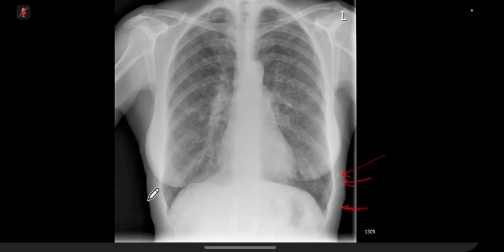So the smoking has resulted in emphysema, but the patient has also got cystic lung disease by virtue of the fact that there is cystic lung disease of neurofibromatosis. Another neurofibroma there.